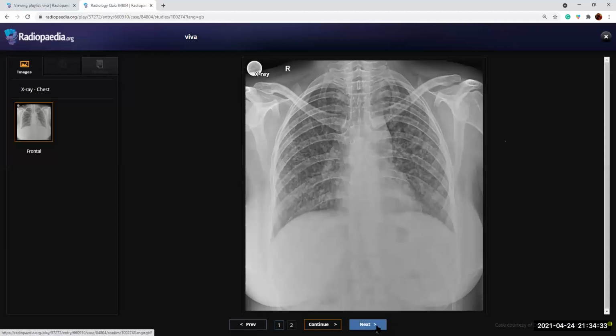These are all classical cases. This is not a very good representation, I know, but it is a case of miliary tuberculosis, and maybe because of the soft tissue it's not seen so well. But the differentials were okay. LCH, and I think you meant RBILD, if I'm not mistaken. Yeah, RBILD. So it is basically miliary tuberculosis. We have to suggest isolation, and that's it.